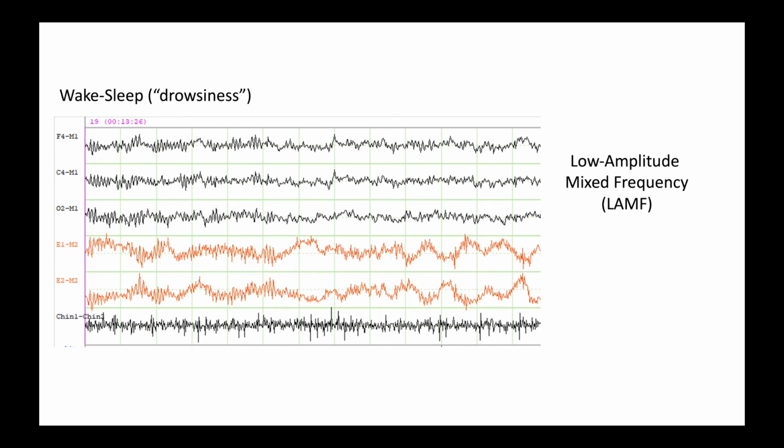In the transition from wakefulness to sleep, you get a further slowing down. So this alpha rhythm has decreased in frequency, and it's harder to pull out waves that are this fast, starting right about here. So here, maybe there's some theta in there a little bit, but there's slower waves. They're not quite as fast as the alpha rhythm here. And this is called low amplitude mixed frequency. And this is a sign of drowsiness or even of sleep onset if this continues into the next epoch.